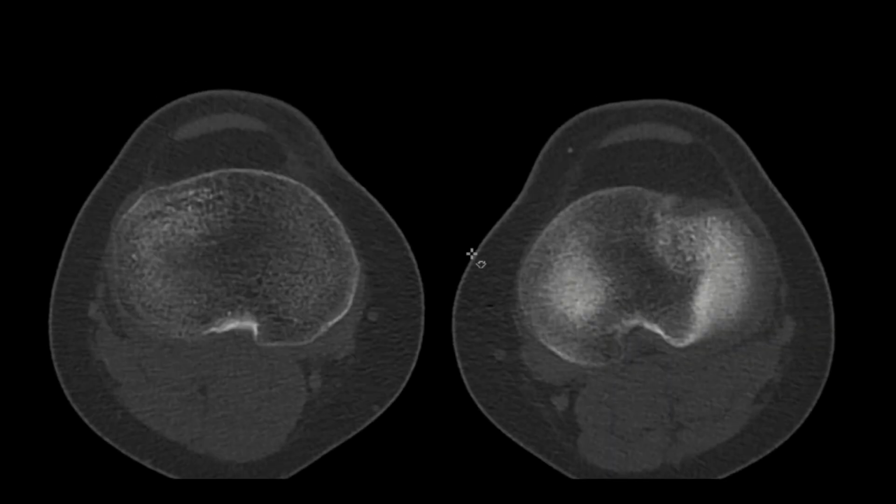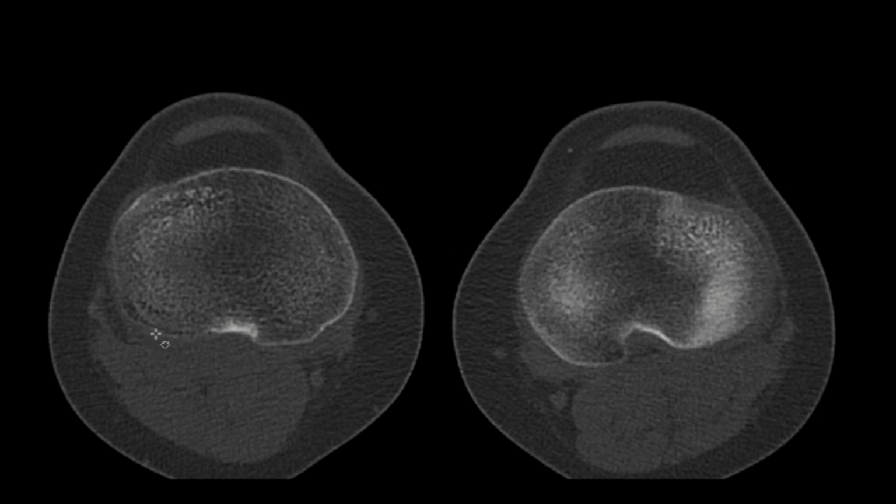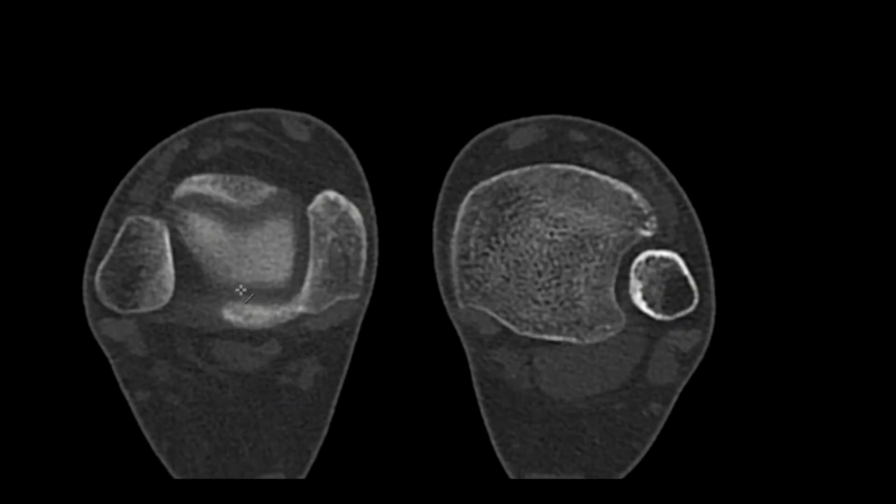In the next step, we want to measure the amount of tibial external rotation. Therefore, we scroll down to the most proximal aspect of the tibial plateau and draw a tangent line at the most posterior aspect of the tibial condyles. Then we measure the angle again to a reference line which is just parallel to the lower border of our screen, and we have here an angle of roughly 5 degrees.